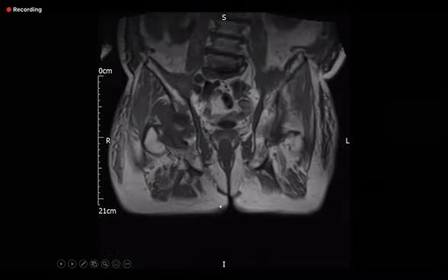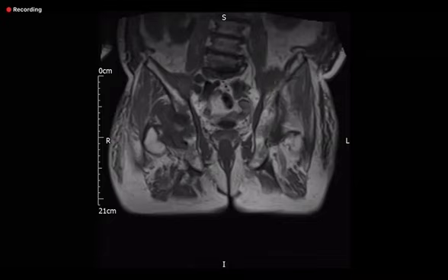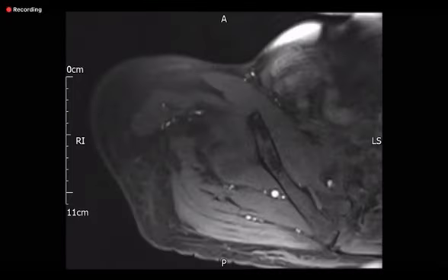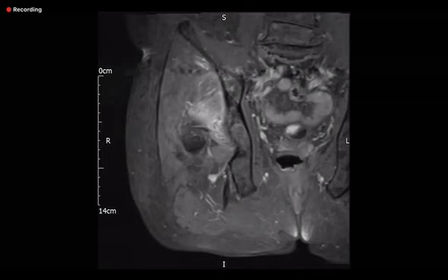Having said that, the key thing here is that observation, which you picked up very well, that something is happening in the right hip joint. If the history is not given, then the examiner will give you a hint and you pick it up. The key point here was that we picked up septic arthritis in a plain abdomen film. This is satisfaction of search, your protocol, you have to look for each and everything. And on this coronal post-contrast, it becomes a very easy case.